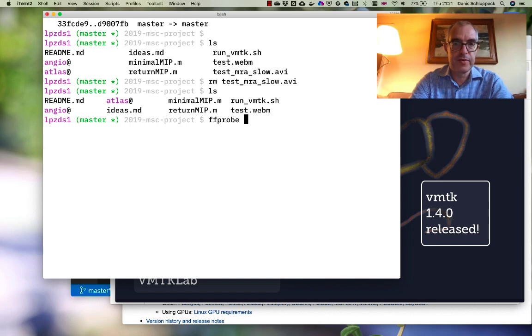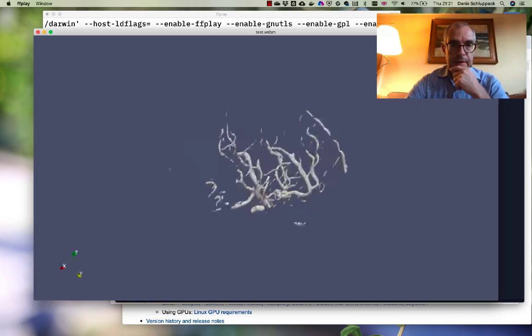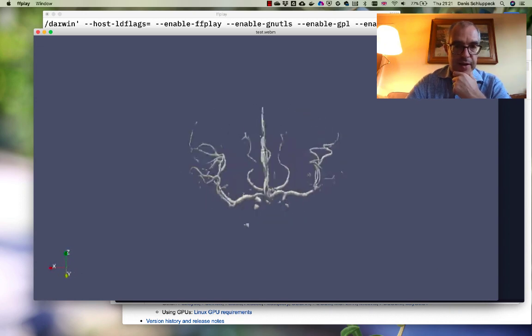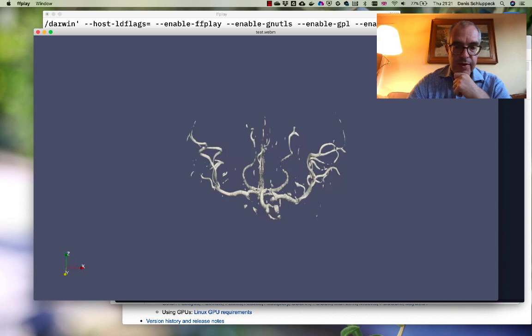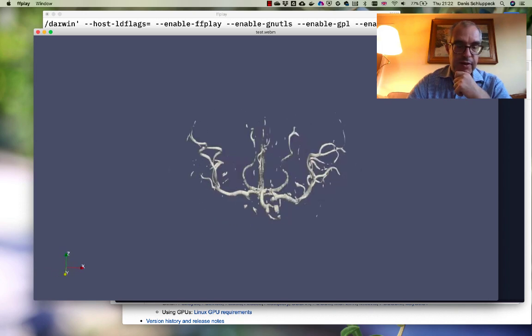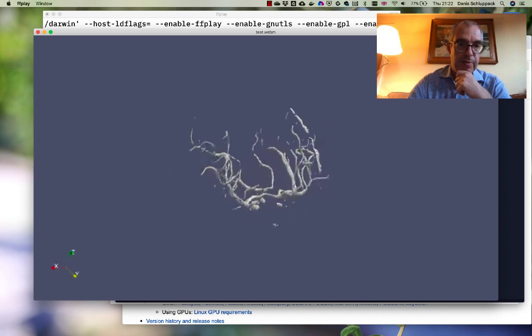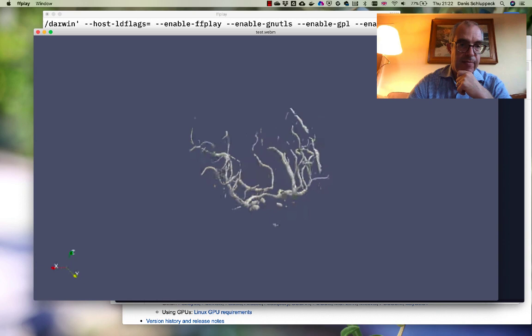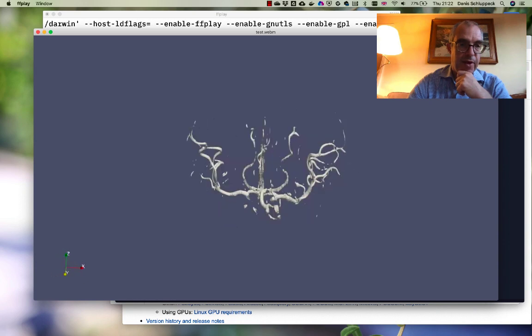Okay, I'm just going to use a command here to play a little video file that I've created. This probably runs a little bit fast, so let me play it again. This is a little movie, a sequence of images of a 3D model that was constructed from the MR angiograms that we collected on this one person.